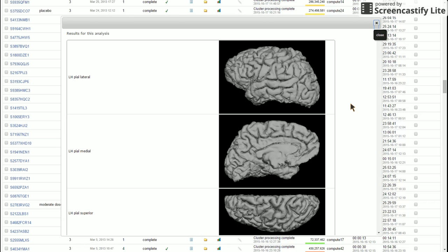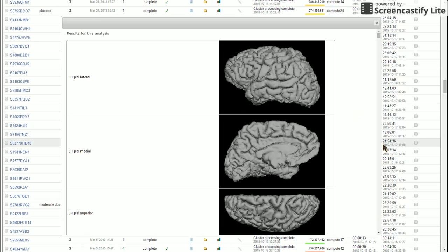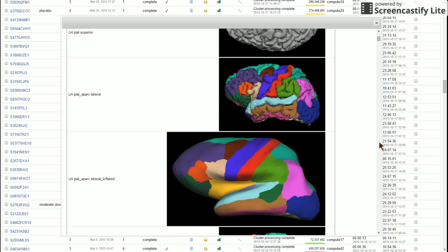So imagine our 8,000 planned FreeSurfer analyses. There's no way that a person is going to go through each one, load them all up, and look for any blatant errors. But by going through here, I'll show you a different way to search for this.